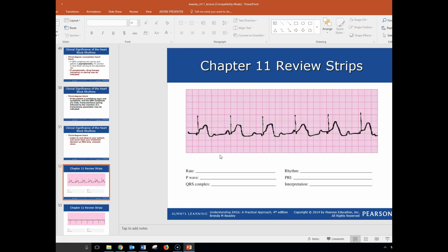So when we look at them, we see our PR intervals, because we have a rate of, ventricularly, hang on, let me get some of this junk. I know you can't see it. So 300, 150, 100, 75, 60, less than 60. A ventricular rate of around 60.